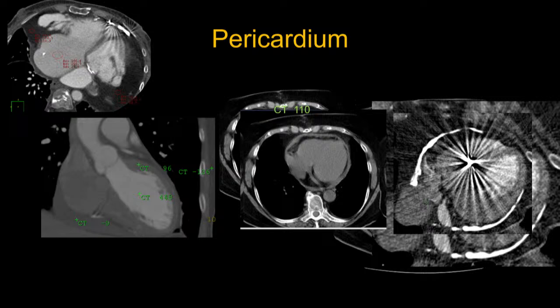Here, for instance, we know for sure it's soft tissue. So I know this pericardial thickening is neither calcium nor fat, it's soft tissue. But I cannot tell, for instance here without any contrast, because the blood and the muscle have similar attenuation, so I cannot tell them apart. That's why we give contrast to help us characterize the tissue in a way, okay?